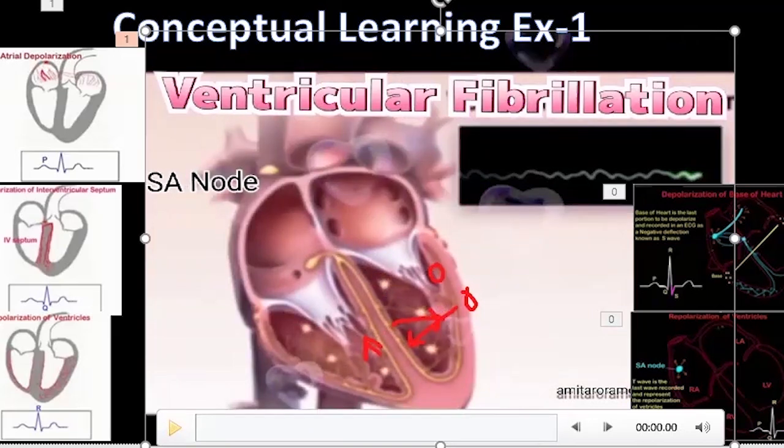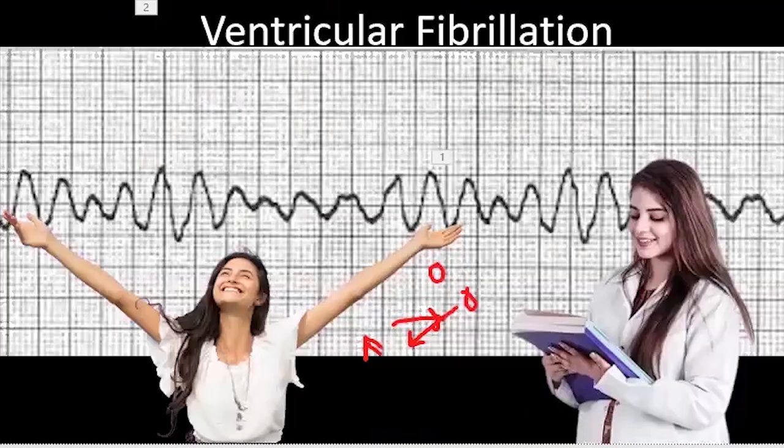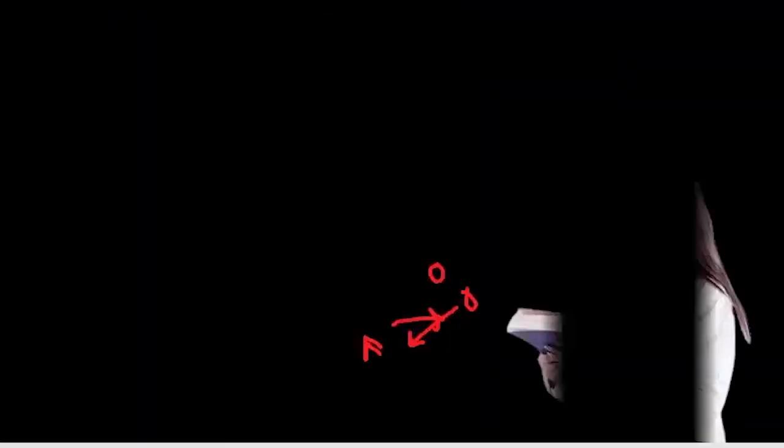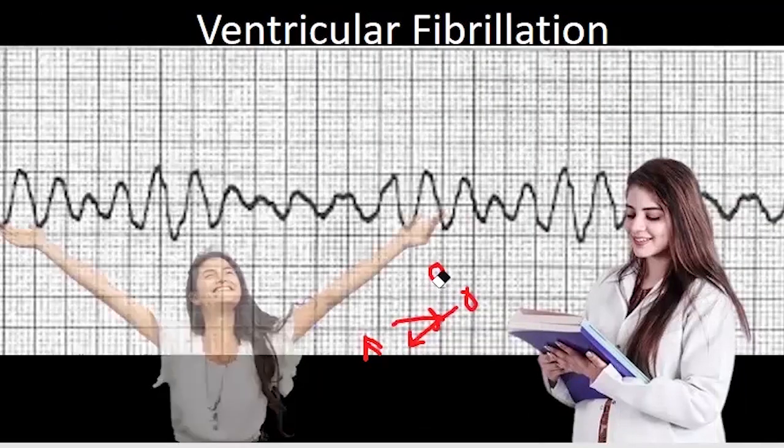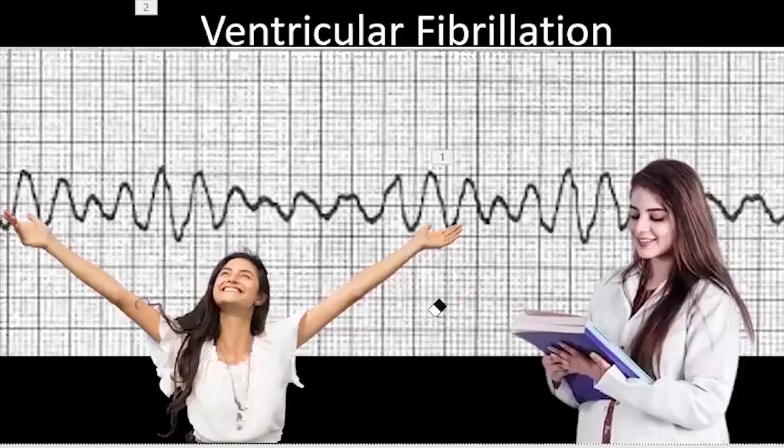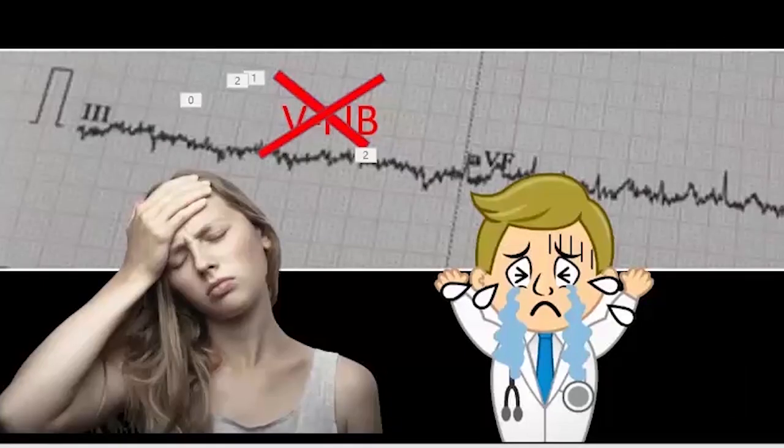So this arrhythmia is very easy to recognize. Even a child can grasp it. But sometimes in a clinical scenario, it can be misinterpreted. Although you learn from the books and all those sources, and although this arrhythmia is very simple, as you can see, in a clinical scenario you can misinterpret this too. So now let us see.